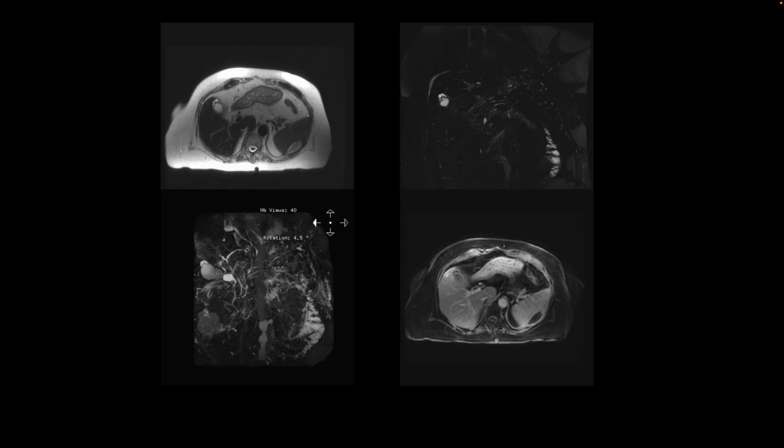Okay, so moving on to another MRI of the abdomen. Here the interesting finding is in the gallbladder. Take a look at this T2 weighted axial image. There are these T2 hyperintense foci at the fundus in a string of pearls appearance, and it's better seen here on the MRCP source image. So that's the fundus, and those are the foci abutting the fundus of the gallbladder.